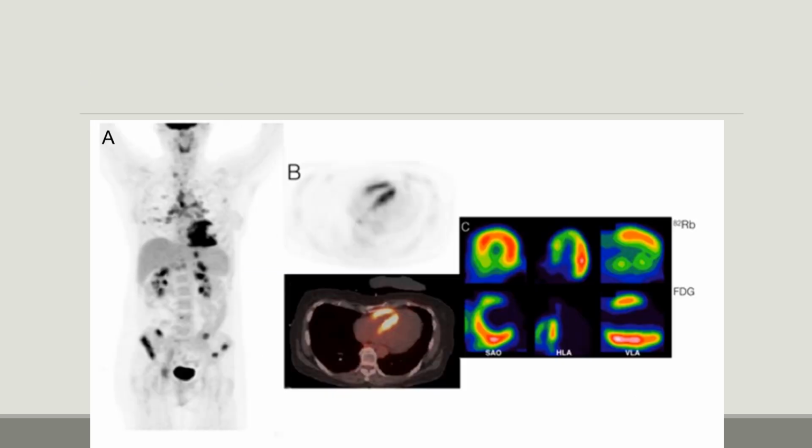This is an example of a cardiac sarcoidosis patient. This image actually has a pretty significant artifact. If you look at where the heart is placed with the perfusion portion versus the CT, this has a major misalignment issue with the fused images, and that's creating an artifact on the scan.